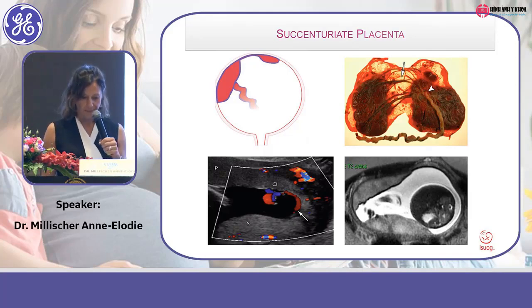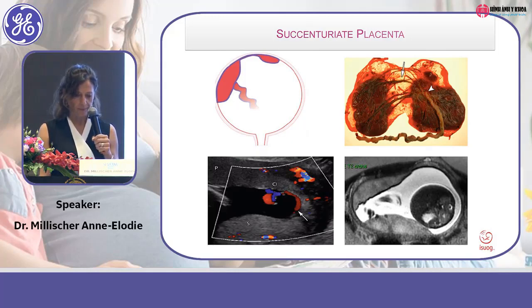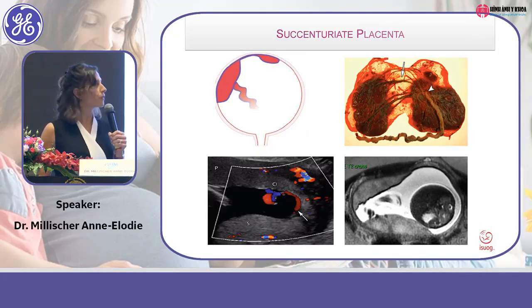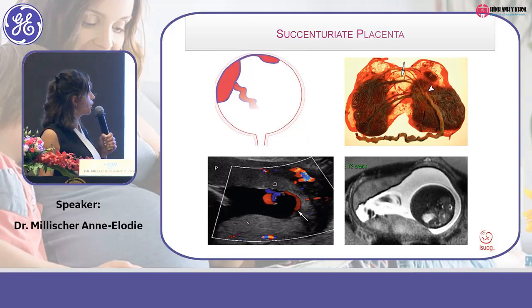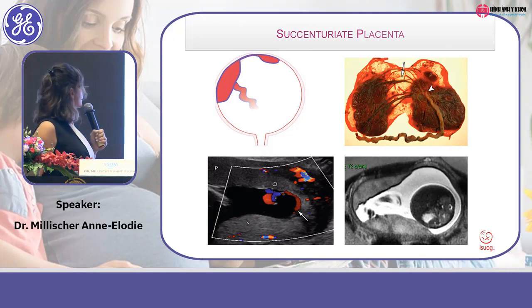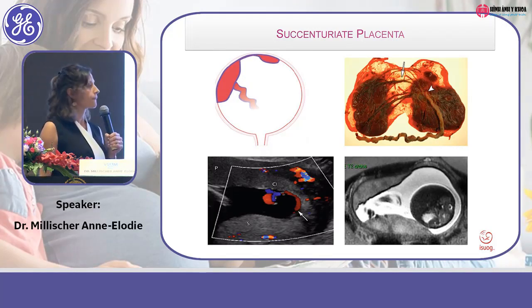Theo cái hệ thống đó, mình đầu tiên sẽ đi vào đánh giá cái hình dạng của bánh nhau và cái đặc điểm, cái biến thể đầu tiên của bánh nhau tôi muốn khảo sát đó là bánh nhau có bánh nhau phụ. The definition of this kind of placenta is the presence of two lobes, as you can see here, with vessels going through the two parts of this placenta. Trong cái bánh nhau phụ này mình sẽ thấy bánh nhau nó có hai thùy, một thùy lớn và một thùy nhỏ, và cái mạch máu nó sẽ chạy ngang qua cái giao diện giữa hai cái thùy này.